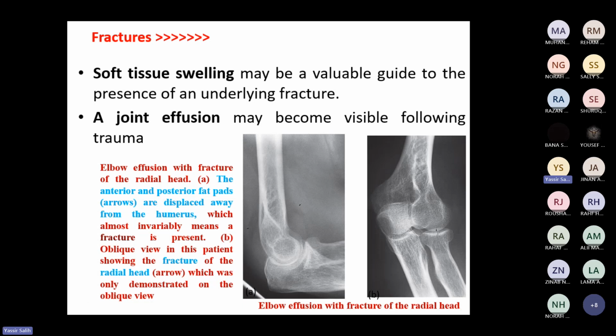And sometimes the fracture becomes a subtle fracture. لكن this soft tissue swelling تلقى soft tissue density around the fracture site. This can guide you to the fracture.